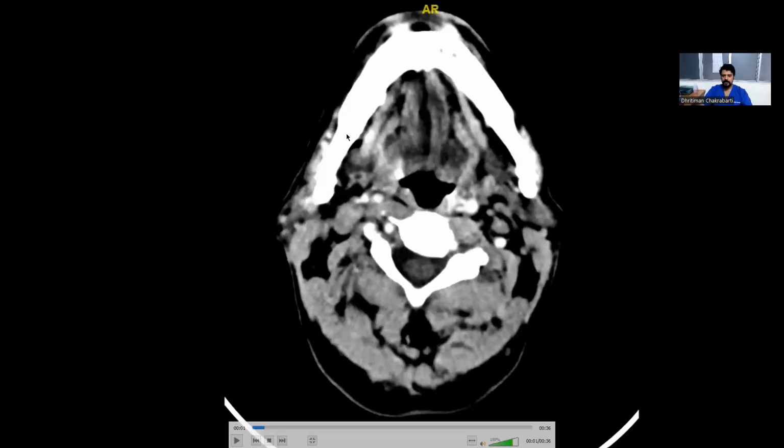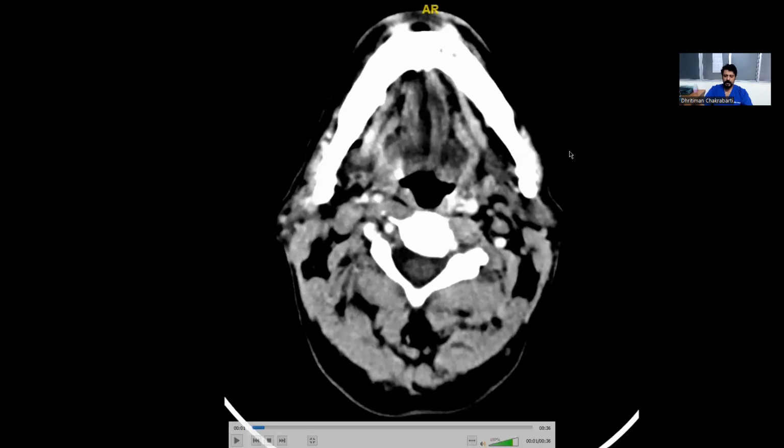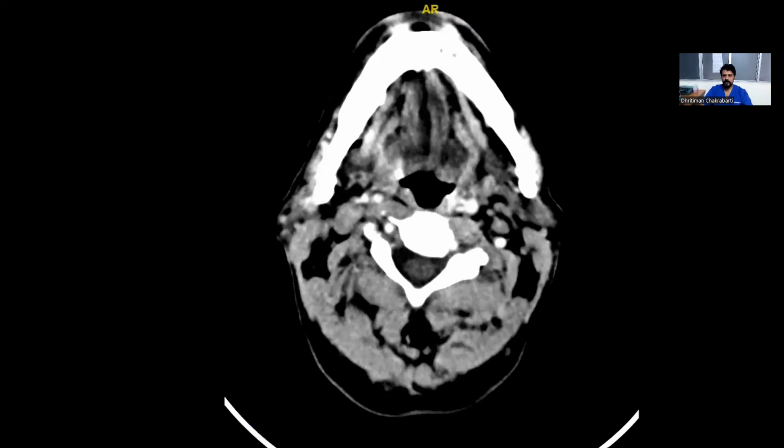Okay, so this is the video of a patient with a right side temporal lobe tumor. In this case, there is a bit of herniation of the temporal lobe, which is crushing the brainstem. Although the patient is completely fine, frankly speaking, herniations are only dangerous when they happen acutely, as in the case of traumatic brain injury, because the compensation mechanisms are not yet active.